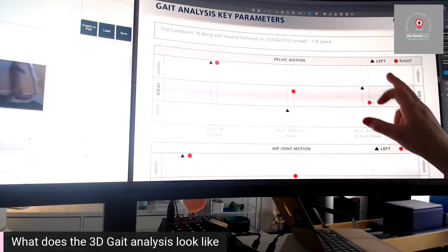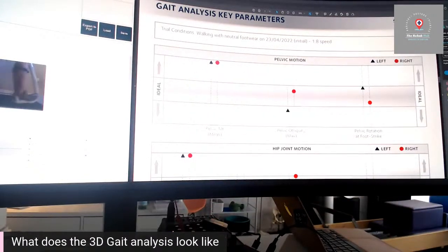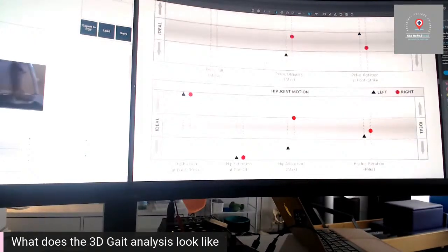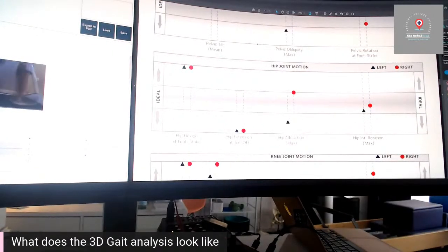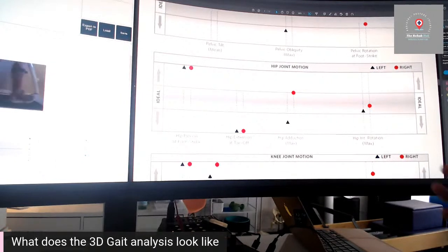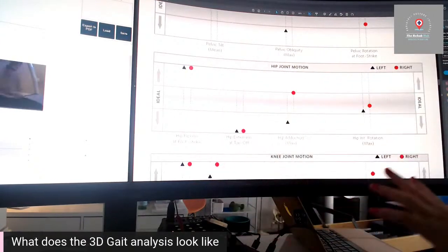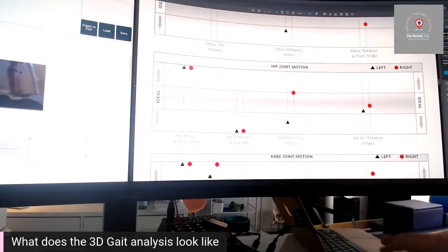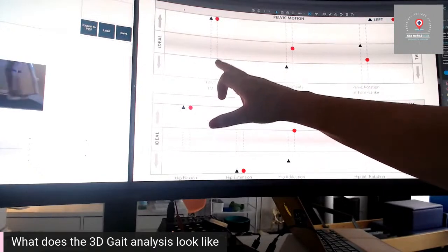That's really where the eyes are drawn to, but we also need to take into account that there's this very high anterior pelvic tilt, which will usually indicate a very low hip extension. In this particular patient, look at that, hip extension is down at the bottom, it can't get any further. So there's clearly some stuff going on with the hips. This particular patient actually came in with lower back pain. This isn't an unusual presentation given that. So we can see immediately the issues aren't just at the lower back. We can see right about that hip where we need to focus our attention. We know about the lower back, how it's sitting when that patient is moving, what it's doing.